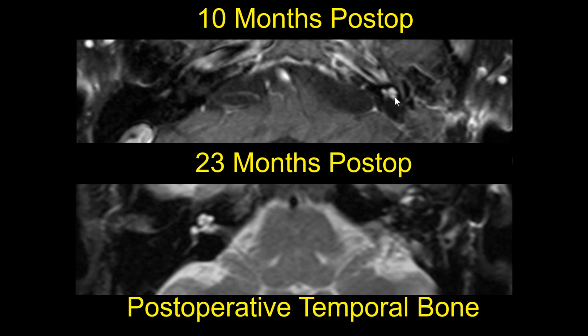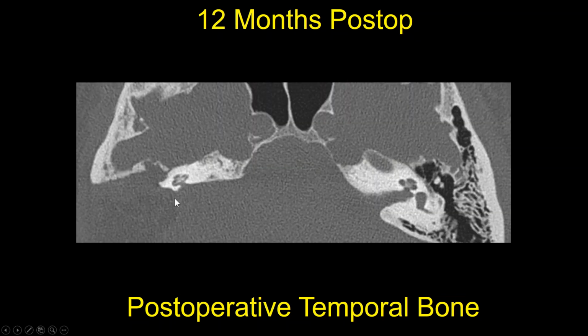Here's another patient who had a similar translabyrinthine approach to the temporal bone, and we see that increased density within the basal turn of the cochlea, very different than the normal side. Remember, we always have that internal comparison, so we can compare the other side to our postoperative side, and we see here that increased density. This does not imply a recurrence or residual of tumor. We can see that with labyrinthitis ossificans, just increased deposition within the inner ear structures themselves.